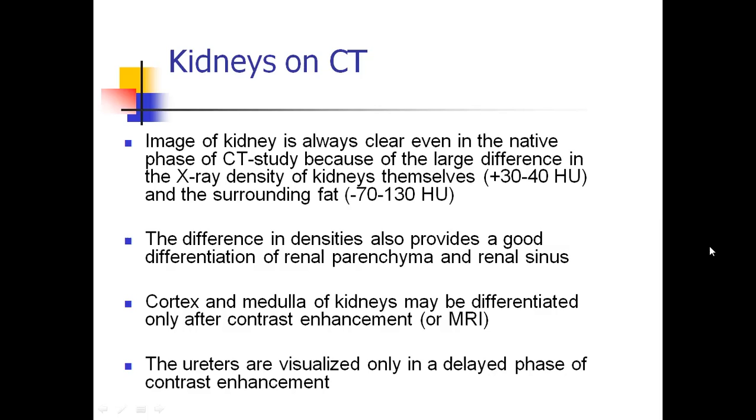The difference in densities also provides a good differentiation of renal parenchyma and renal sinus. Cortex and medulla of kidneys may be differentiated only after contrast enhancement or changing from CT to MRI. The ureters normally are visualized only in the delayed phase of contrast enhancement.